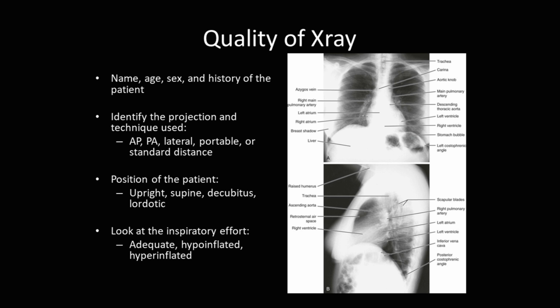The position of the patient, whether they're upright or supine, which we'll also discuss, whether it's decubitus or lordotic possibly, and then look at the inspiratory effort. This will go into further detail also, whether it's adequate, hypoinflated, or hyperinflated.